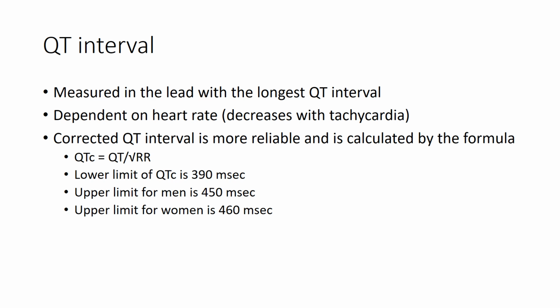The QT interval is measured in the lead with the longest QT interval, and it is dependent on the heart rate such that it decreases with tachycardia.